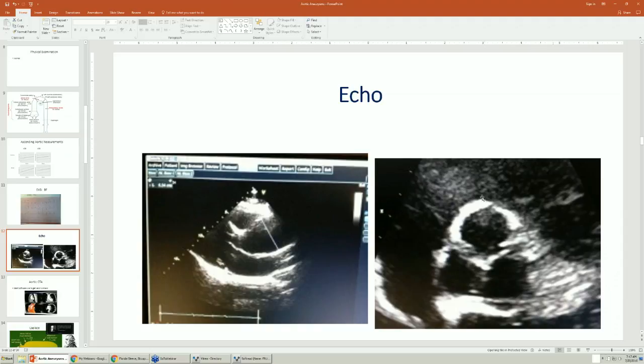This is a picture of the aortic valve, and collagen vascular disease of the aorta is frequently associated with a bicuspid aortic valve. Here's a leaflet, here's a leaflet, here's a leaflet. So it's definitely not bicuspid, it's tricuspid. This is the upside down Mercedes-Benz emblem, and you can see there are 3 leaflets. You can see the dilatation actually starts above the valve and then proceeds on, so the sinotubular junction appears to be dilated, maybe even the sinus of Valsalva.